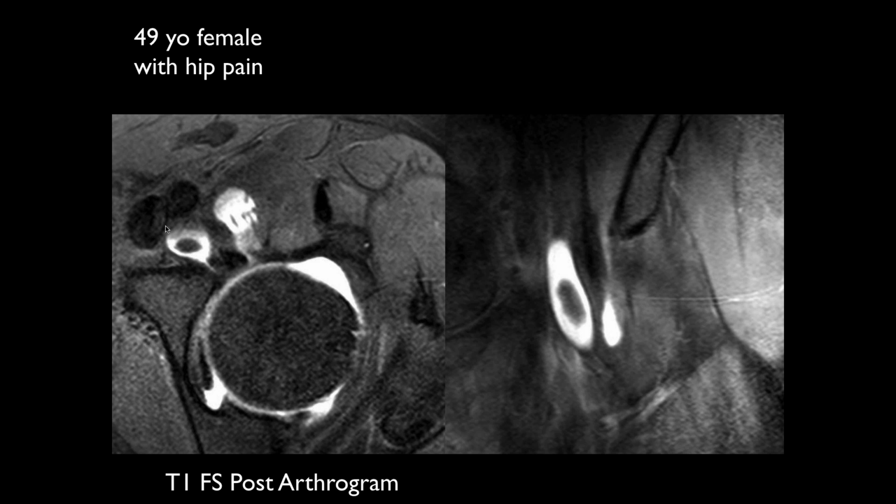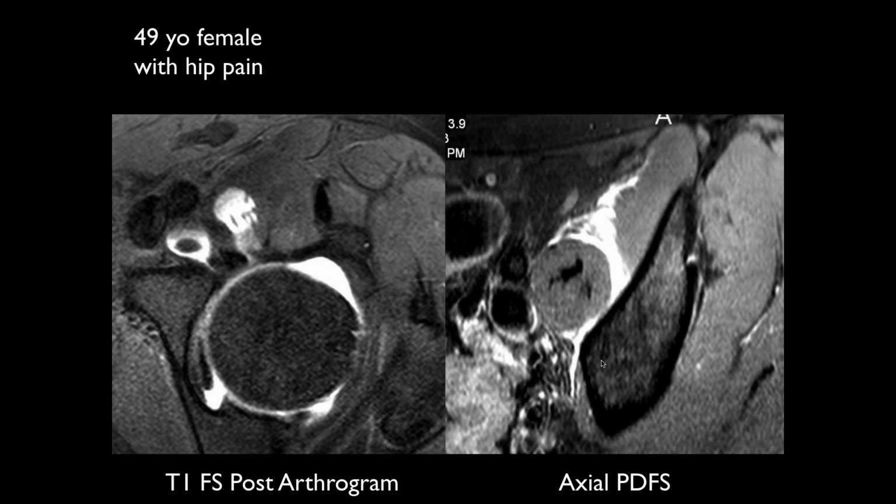Okay. So these are the vessels. What is this? Well, this is the labrum, and then this is the capsule, and this is like contrast going from the joint outside. It looks like maybe it would be a labral tear. Well, this is probably the labrum here. Do you know what this is? So that would be just the iliofemoral ligament capsule, or Okay, oh, I see. Let me see.